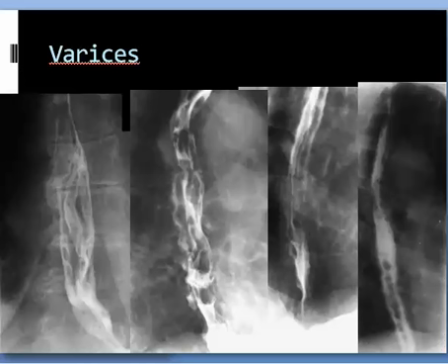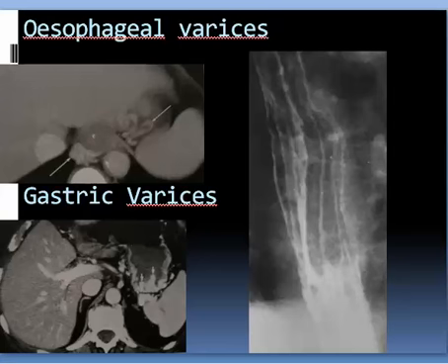Of course, once there is history of hepatitis, there is clinical suspicion of varices and bleeding, the appearance is in more favor with varices. For example, you find hepatosplenomegaly. The presence of varices along the esophagus is usually with smooth outline like this, smooth longitudinal folds.